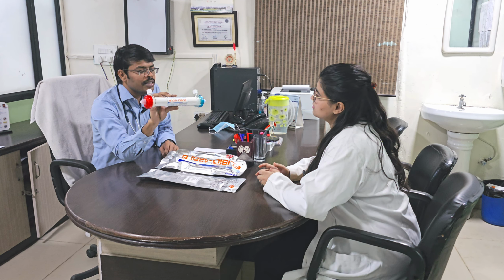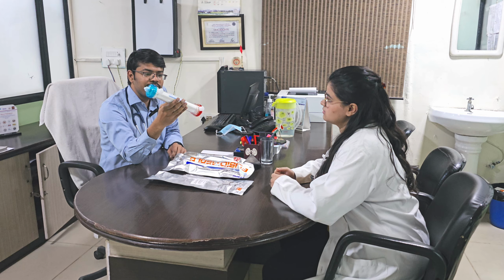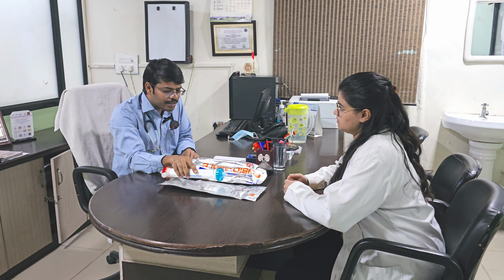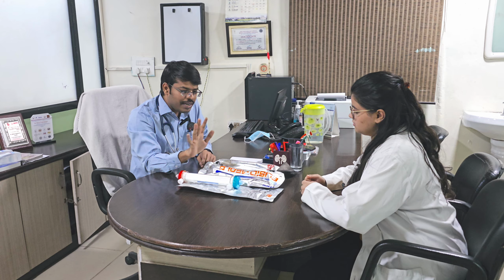Pragati, this will be the exam spotter for your final exam. Today we will see regarding the dialyzer and what are all the expected questions you might get in your exam. So various types of dialyzer are kept.